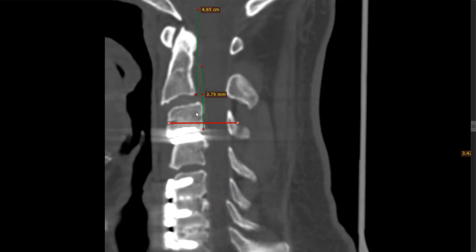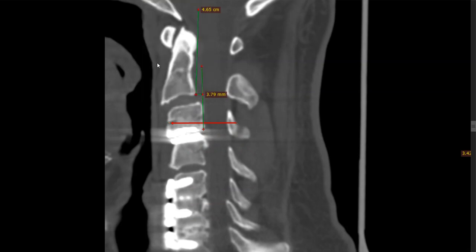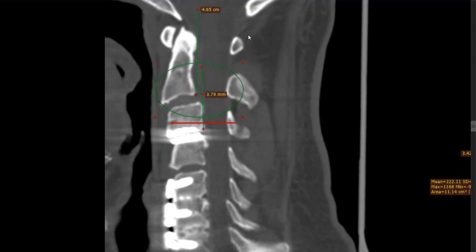Okay, so what we're looking at right now, this would be your big snapshot there. Anterolisthesis, C2-3. I don't think I can type in this thing? I've not typed in this thing yet. Okay, next sign.